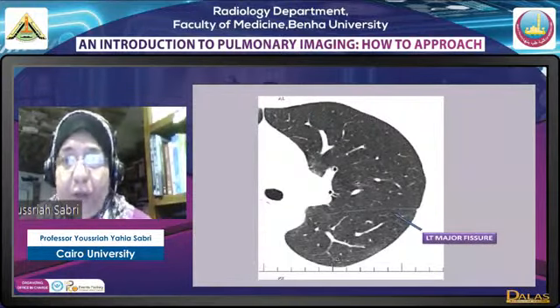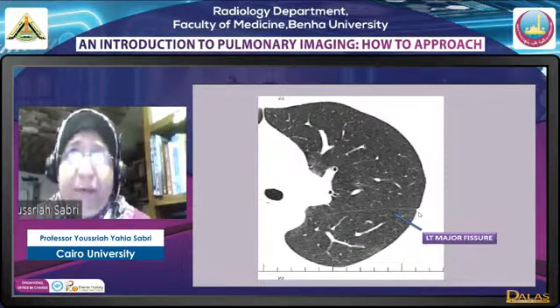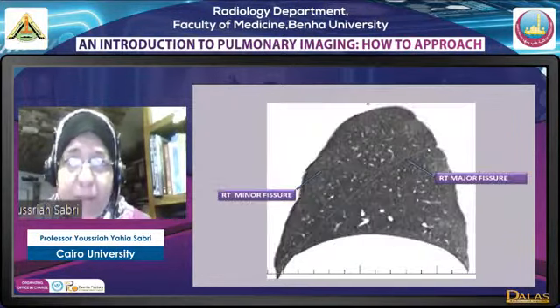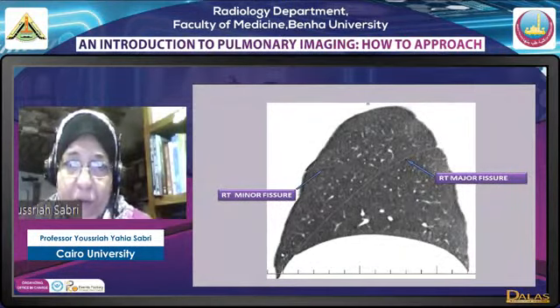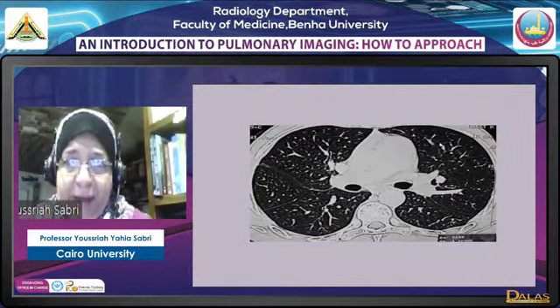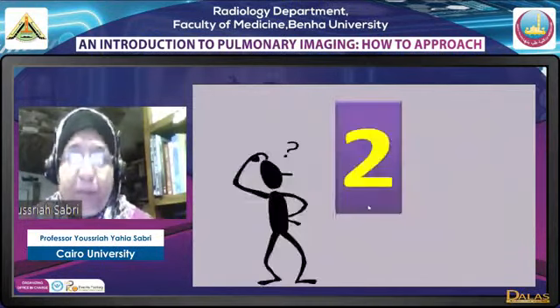في حين ال high resolution where we take very thin sections of less than 2 millimeter, we will see the fissure as a line. If you don't see the fissure, this is not a high resolution. تمام؟ ده high resolution معمول volumetric study. تمام؟ وبالتالي بنعمل reconstruction بنفس الجودة، بيبقى عندنا ده الماينور فيشر وده الميجور فيشر. في طريقة تانية لعمل الهاي ريزوليوشن ان انا باخد اكزيال ثين كات ايمجز، دي برضو اهو الفيشر بان، فده هاي ريزوليوشن، بس المشكلة انه بيبقى الصورة ليتل بيت نويزي وبتبقى فيه some diagnostic problem especially في النودولز.